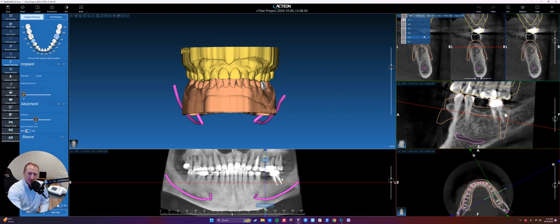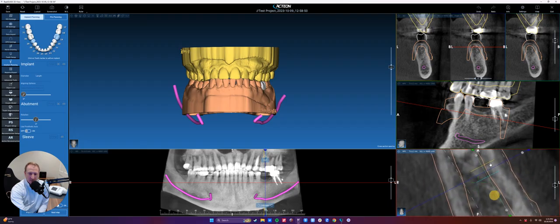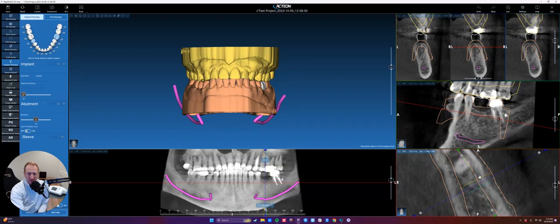Okay, so let's take a look just briefly at this 3x1, which is a popular configuration. If we have a 3x1, we can choose the thickness, which we should still keep probably at 0.3, which is the smallest thickness, but the spacing might change. So let's say you want all of your slices to be 1.3 millimeters apart. And what we'll see if we zoom in and take a look at our axial slice, see how there's now a yellow and a teal as well as a blue, and notice a yellow outline here, a blue outline, and a teal outline. So this is showing us how far apart those slices are.